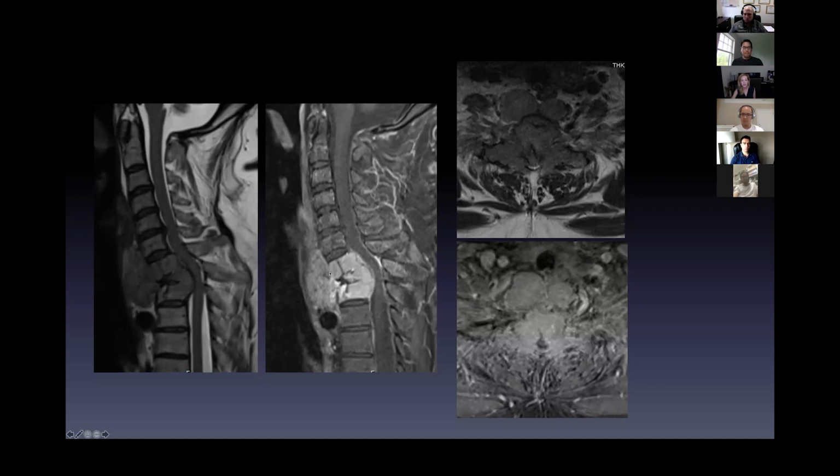Then you go to the soft tissue. So we see it's coming out into the prevertebral space. I don't know if I'm answering your question. You kind of have to maybe be a radiologist, or listen to your radiologist, to know that your esophagus lives right here. And this is the signal of an esophagus on T2, and on post-contrast, enhancing mucosa of the esophagus. And then the characteristic shape of the trachea, and you can see probably thyroid gland around it. And then on this and on CT, we'd also look at the vessels nearby, which you can actually see on my next slide as well.